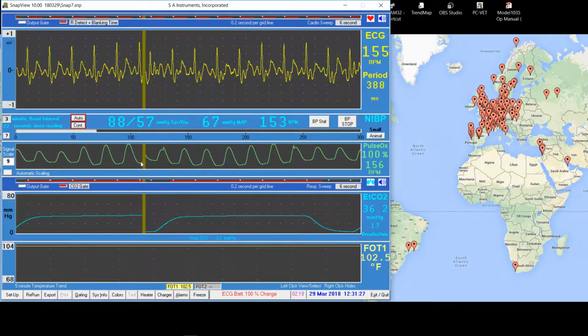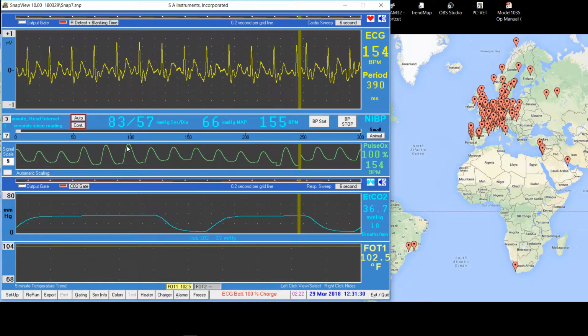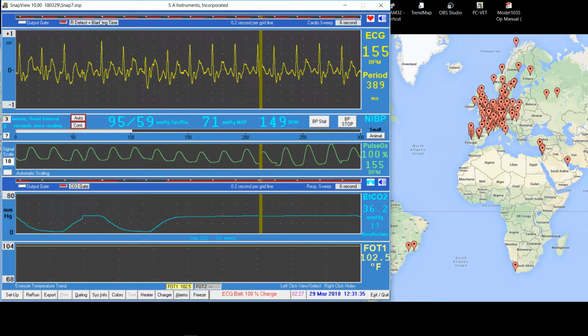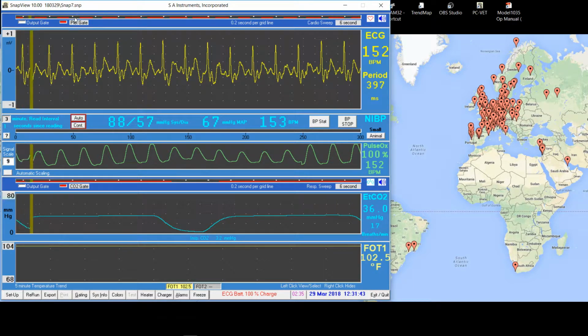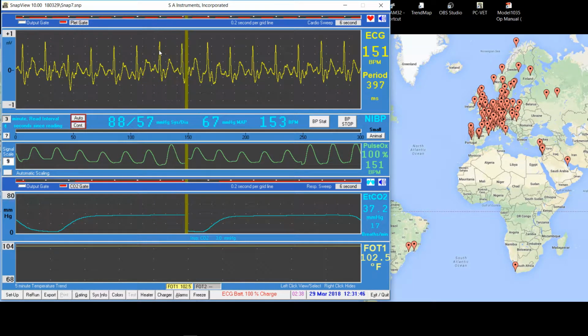The peak of the plethysmogram waveform is also automatically detected by the system. The indication that the peak was detected can also be displayed in the cardiac sweep display. Right or left click in the region to the right of the red icon to select plet gate. Note that a red bar is displayed above the peak of the plethysmogram waveform.